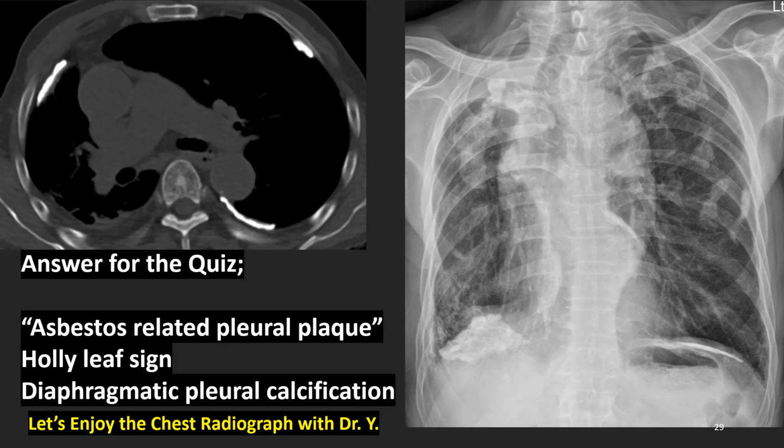We just finished the introduction of lung cancer findings on chest radiographs and chest CT. Lung cancer is the leading cause of cancer deaths and very, very important in daily practice. So please remember the findings which I have shown to you. And the next several sessions will also be about lung cancer. Lung cancer is so important.